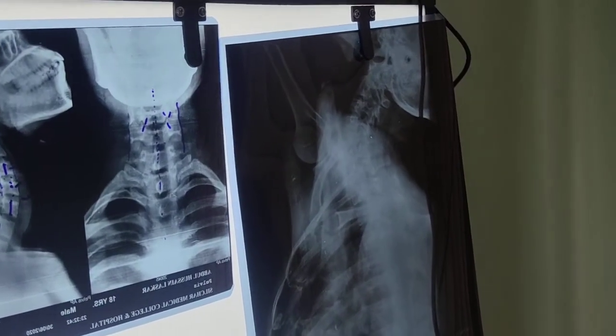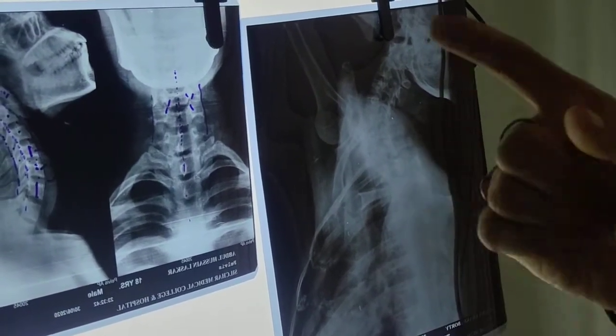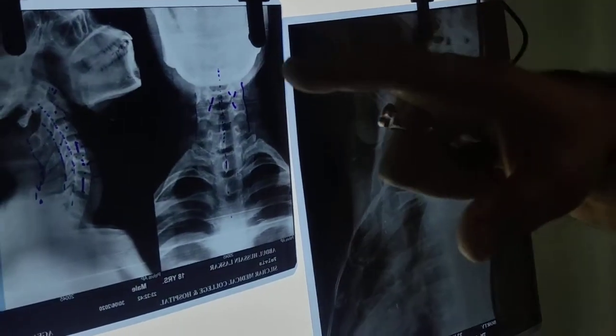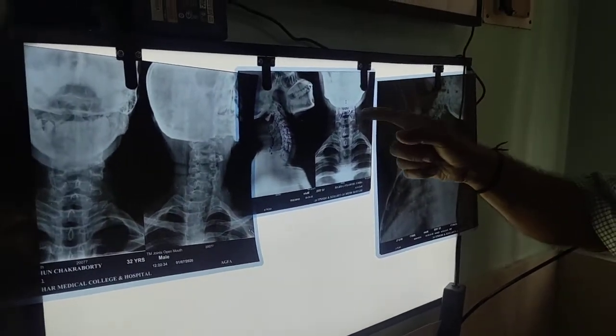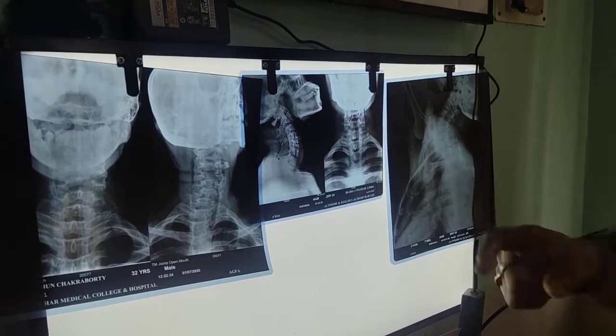Yes? So in a nutshell, these are the X-rays. We are not taking CT scan or other things. We have discussed the craniocervical junction. We will discuss the subaxial junction, the open mouth view, the AP and lateral views, and we will also discuss the swimmer's view. Okay, we will go there again and discuss.